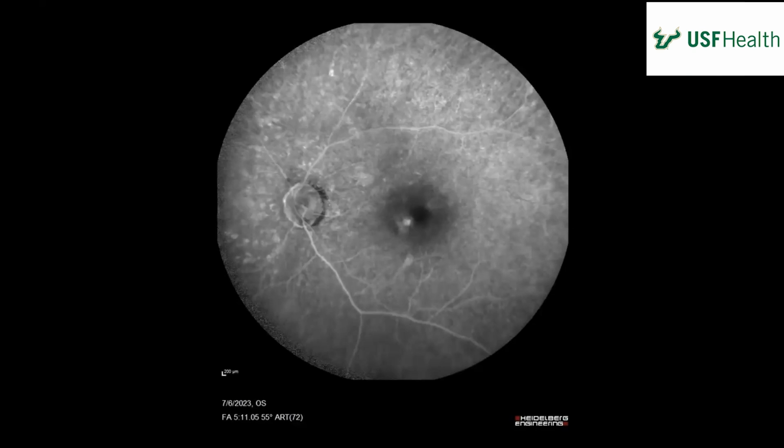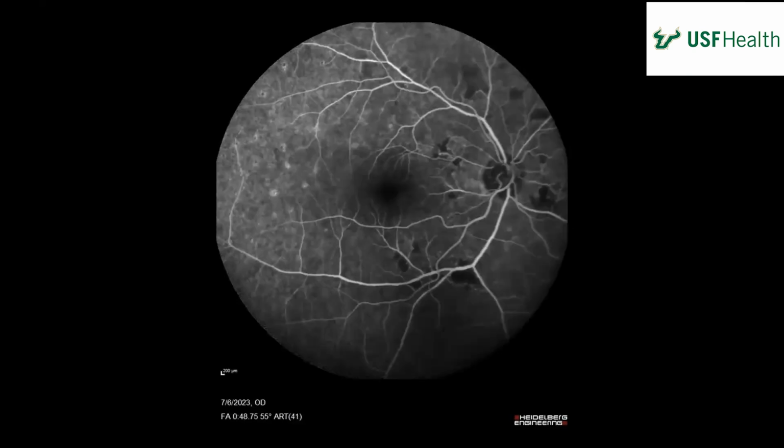All right, and we're gonna move on to the other eye. This one has less images. Okay, we only have 3 here. So I've put a few areas of the hypofluorescence, kind of in that superior arcade, inferior arcade near the nerve portion, which I would imagine will correspond to those areas of heme. And then also some hyperfluorescent areas towards the end of the arcades.